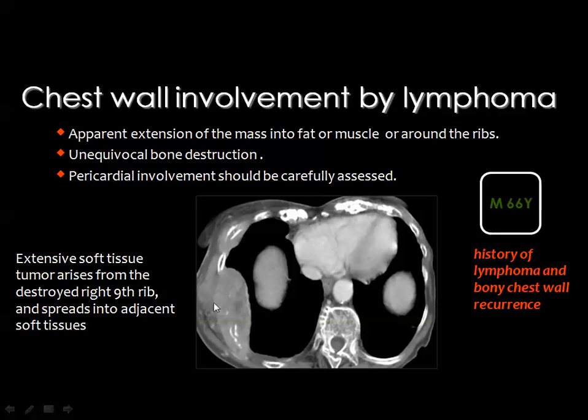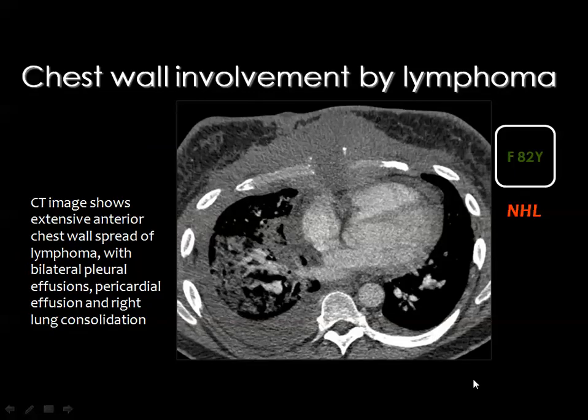And if you remember, when I talked about the chest wall pathology, I said that whenever you see a lesion that is centered on the chest wall, I mean it has an internal component and an external component of similar size, and you don't know any information about the clinical data, and you consider metastatic deposit the most likely, you go for biopsy to confirm the diagnosis and to know the primary malignancy.